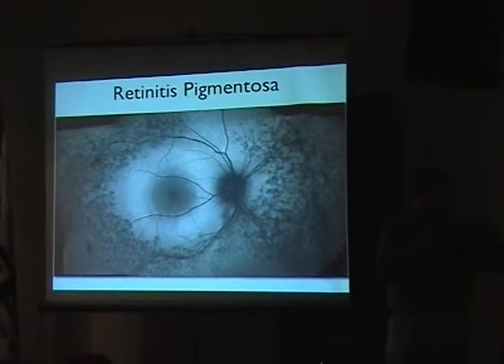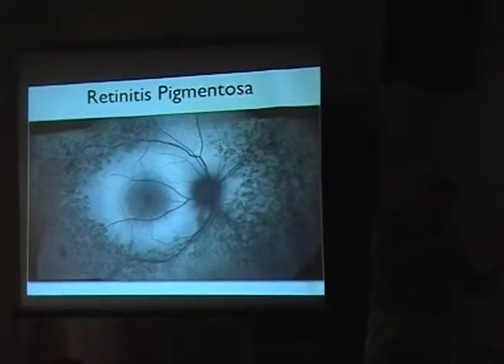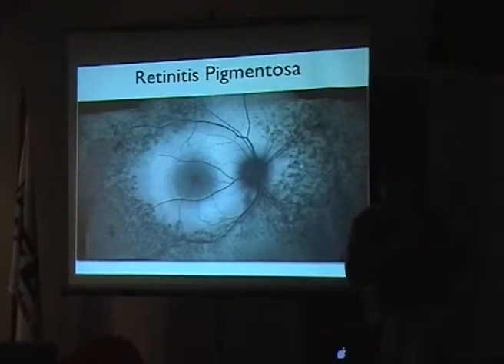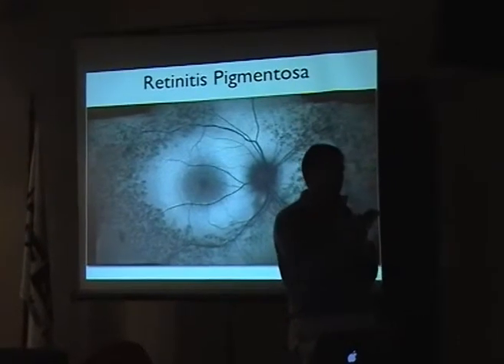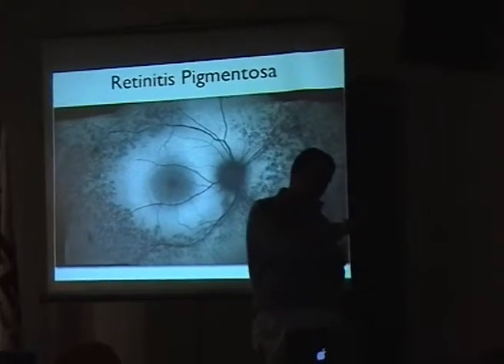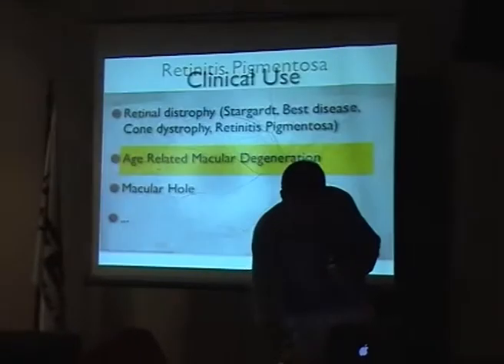fluorescence, because sometimes you actually have an area that has less fluorescence, and the one that is normal looks higher, but it's the other way around. So things can be not as your eye gives the first impression, but think that it can be the other way around. You know, it's hypofluorescent and not hyperfluorescent.